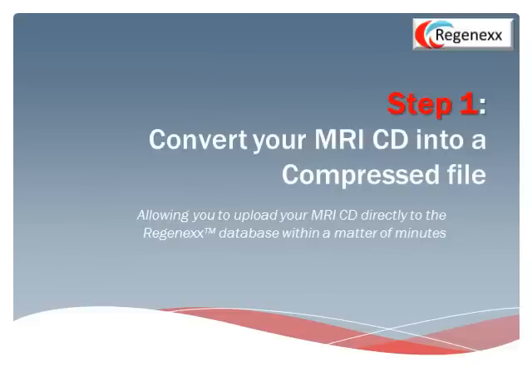The first step is to convert your MRI CD into a compressed file. Compression is a very handy tool that will help move these data files through the internet securely to our servers. Because of the size of these files, it's necessary to compress them.